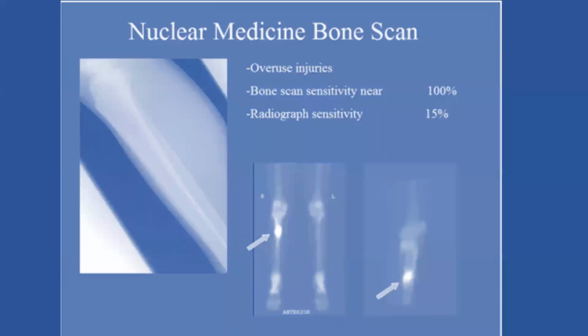What does nuclear medicine also help us with? We know nowadays sports has become very popular. We have runners, we have marathon runners, etc. All these interfere with the remodeling of bone, where the load on the bone is much more than the time for remodeling. As a result, you end up having a stress fracture, as has occurred in this patient.